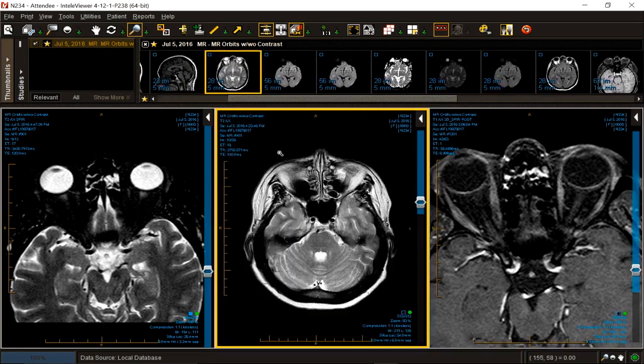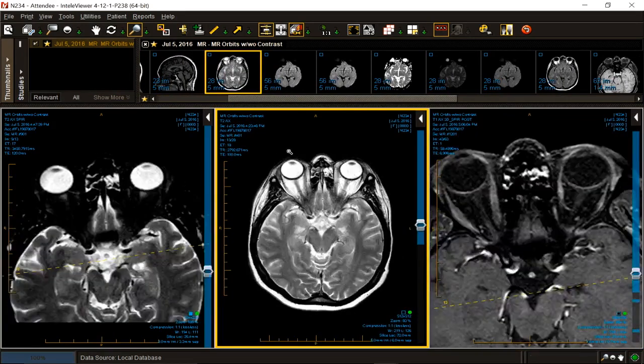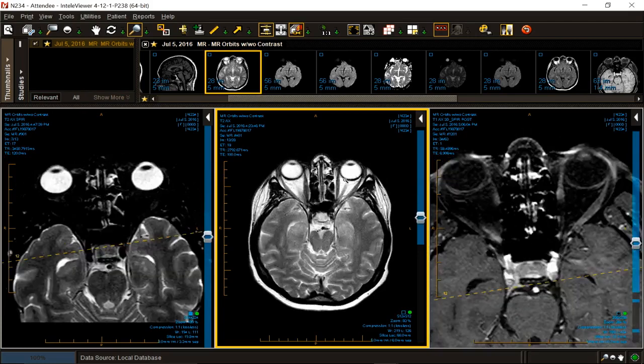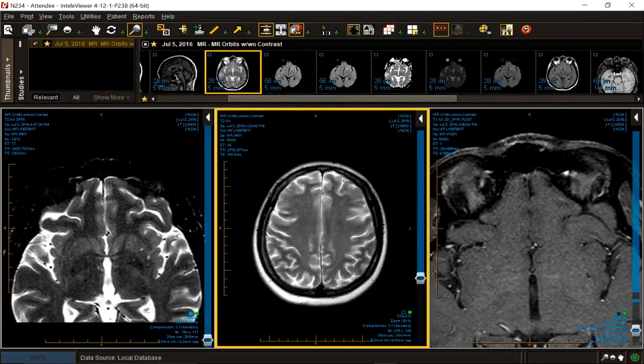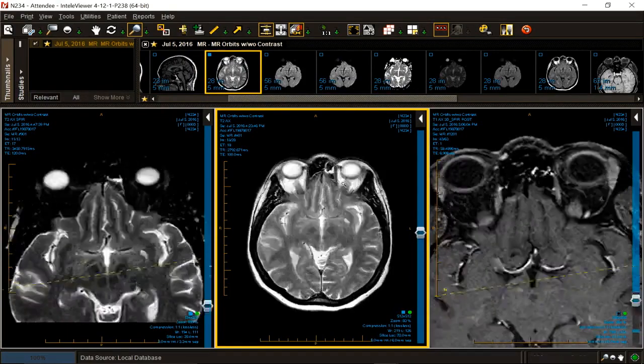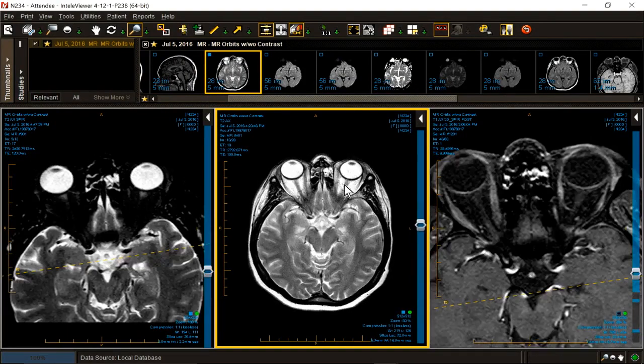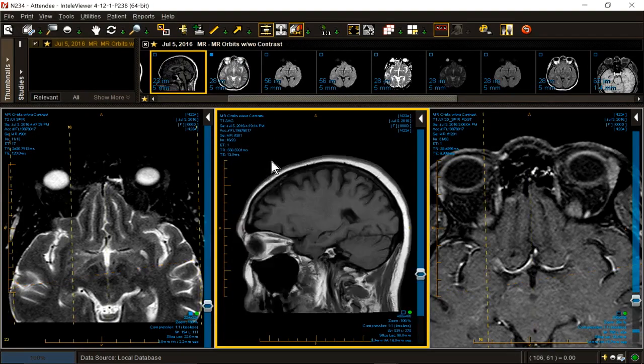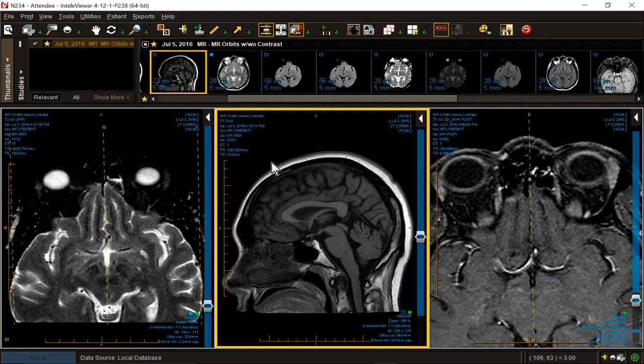So now let's go back to the overall just straight brain. There's a polyp, there's some sinus disease. I think that's probably the guts of the case. Anybody have any other comments regarding findings?